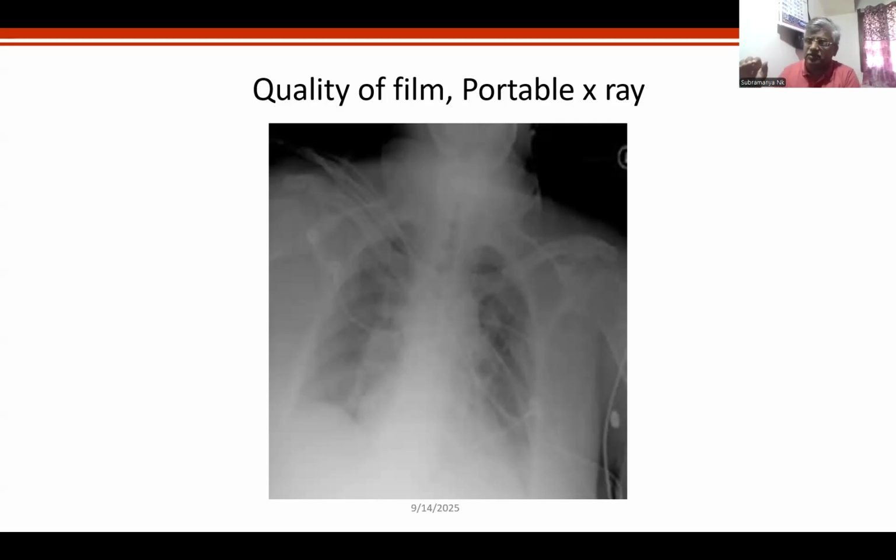The technician has to be good. And what comes to you, you just comment on the exposure. Don't worry about trying to regulate the exposure from your side. And if it is underexposed, beware of these things. That's all. Don't worry too much.